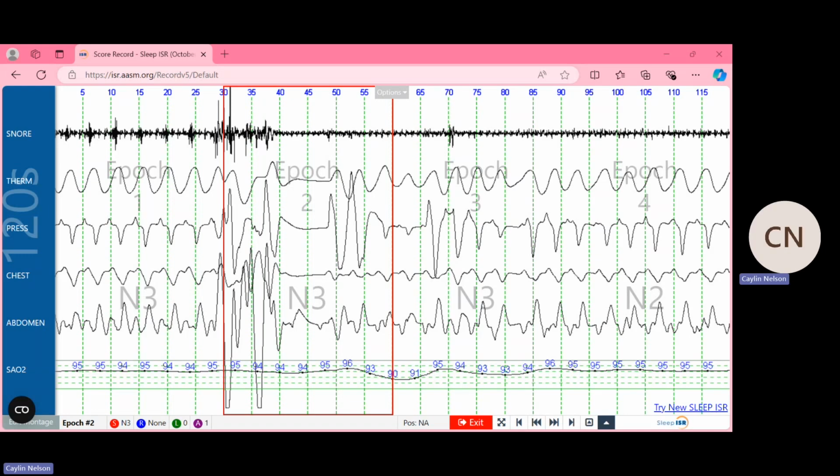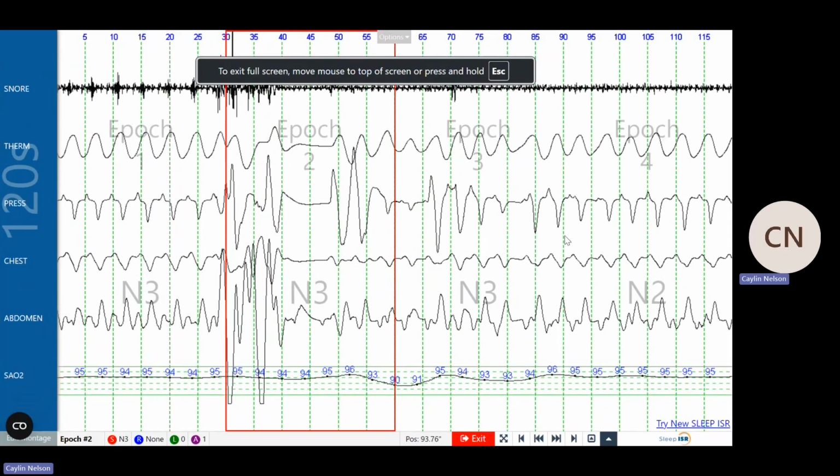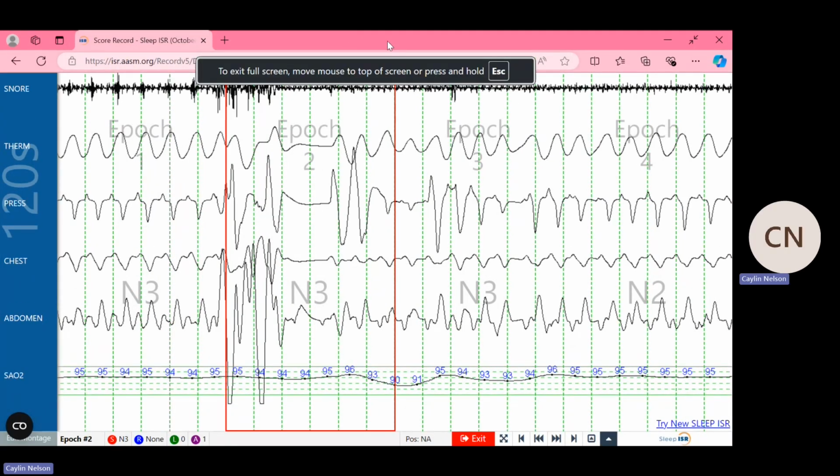Back to the oxygen level, our main change happens around, it's kind of covered up by the little options bar at the top, but underneath the options is where our 60-second is.